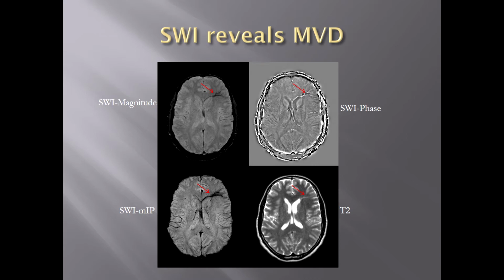And then we have a very interesting case of blast, where a soldier was impacted by blast and thrown backwards and hit his head. You can see here clearly in the upper left image the vascular area shown here, that is a representation of increased deoxyhemoglobin, which practically means reduced perfusion to the brain.